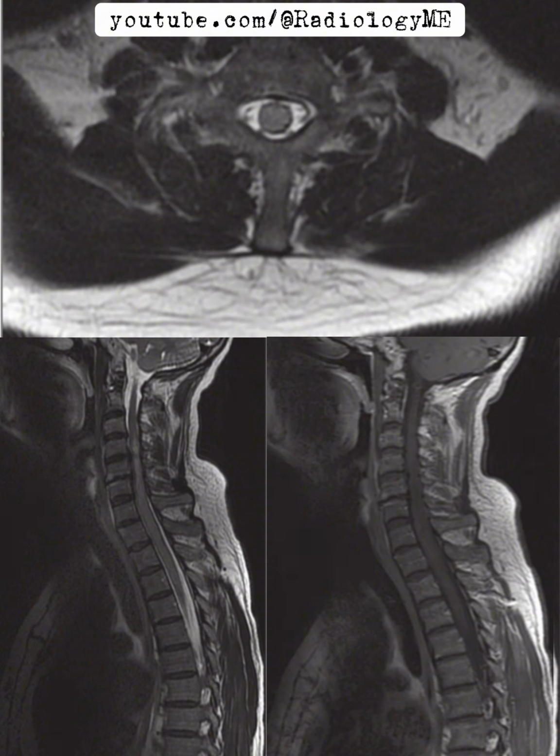So, my plan moving forward would be to discuss this case with the referring clinician, reviewing the remaining diffusion-weighted images in detail. We need to confirm the extent of the infarction and potentially assess the clinical history for any procedural links.